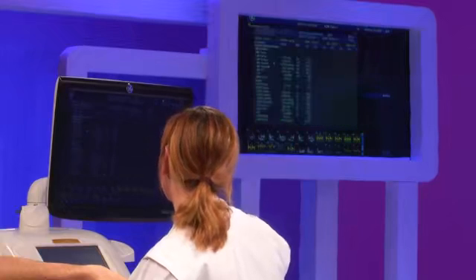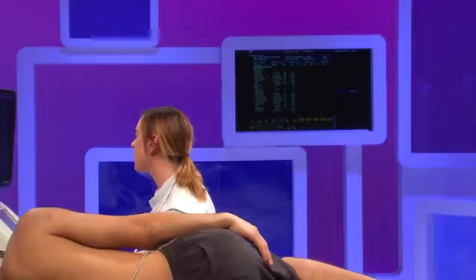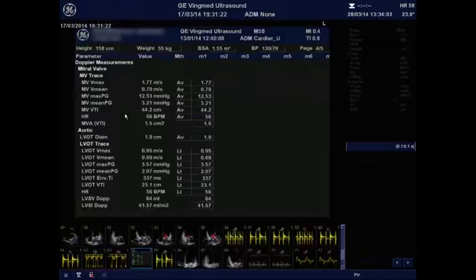So here you realize that we have all the parameters to calculate the effective valve area, which is 1.5 centimeters square. You need to compare that value with the reference value available in the literature. For a Sorin number 27, you should expect a mitral valve area of 1.7 plus or minus 0.4. So you are in the range of normal value, and this is perfect.